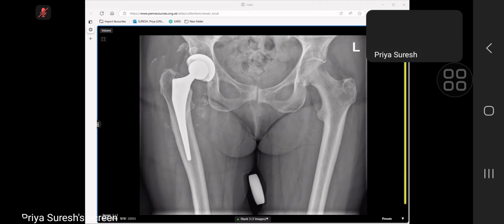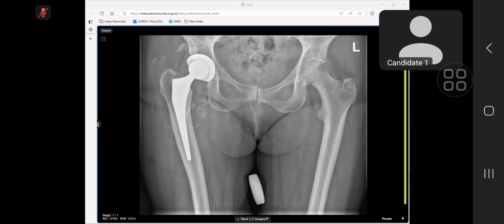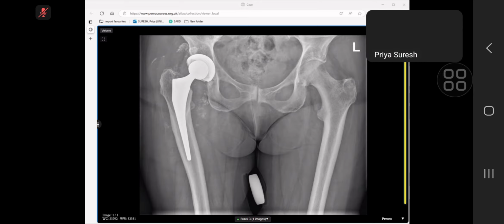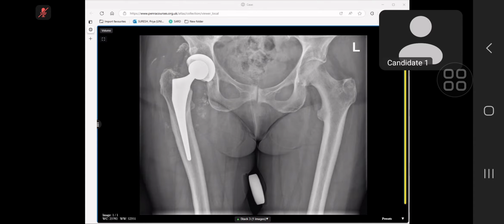So at this point, what is your diagnosis and what would you like to do? It can be heterotopic ossification, but usually they are very well defined and circular in appearance and close to the joint. It seems an osteoid matrix has developed around the joint, and it seems to be an aggressive process. So I would like to see MRI to further comment.